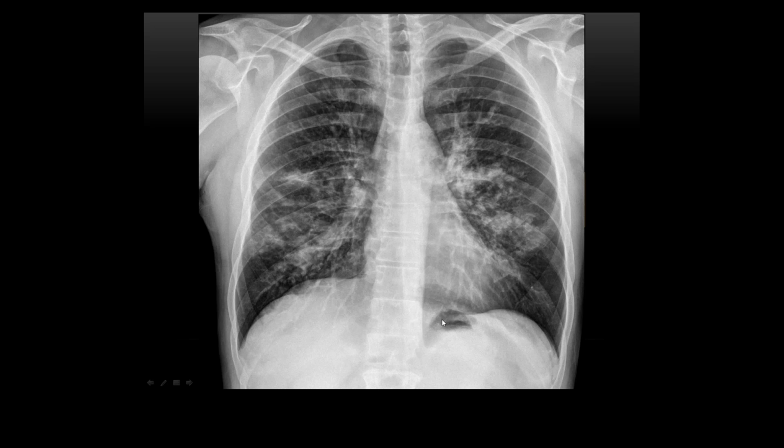I want to scare you a little bit now. This is actually TB. It was reported as COVID, but it actually came back as TB. Now, it is an atypical presentation of TB. So with TB in your chest, you tend to get apical changes first. You'll get consolidation of your apices. You'll get lymphadenopathy. You might get mediastinal lymphadenopathy. And so that was why the reporter went more towards COVID, particularly in the current climate. But it ended up coming back as TB, that one.